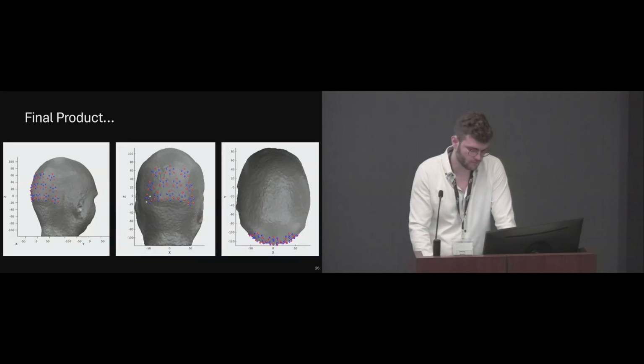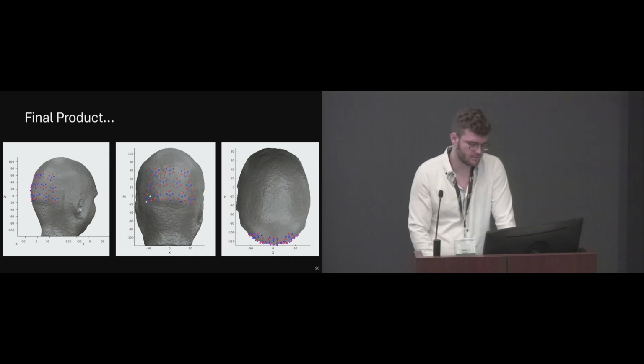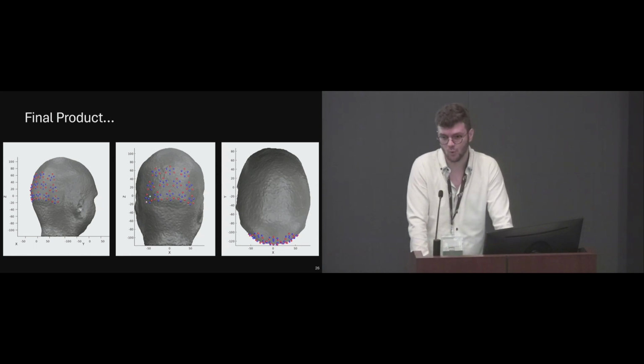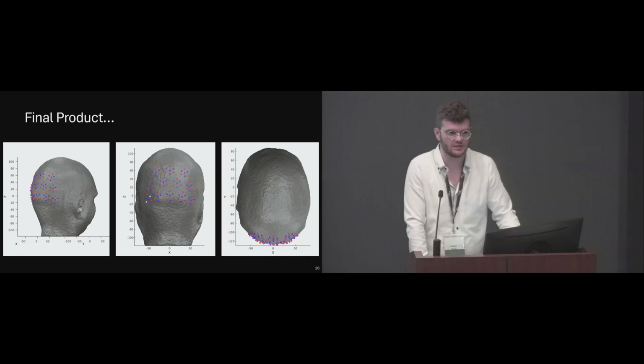And then when you're done, you'll end up with optodes, red for sources, blue for detectors, on a mesh. If you're looking at the middle image and you see the pink and light blue, those correspond to source number 1 in pink and detector number 2 in blue. It's just a visual way for us to show the first optodes for sources and detectors in that measurement list.